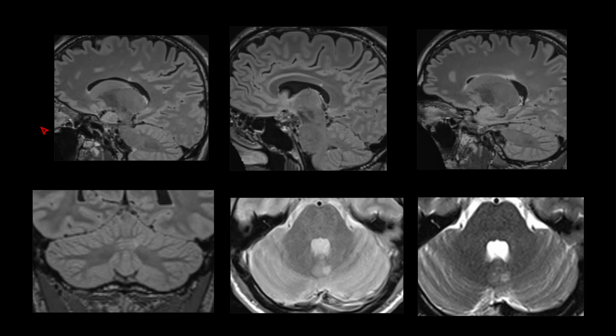So this patient went on to get a brain MRI, as we alluded to in our first question, and here are the brain MRI images. You can see here there's a lesion involving the corpus callosum touching the lateral ventricle, and then here you can see a lesion in the posterior fossa, an infratentorial lesion involving the cerebellum near the midline.